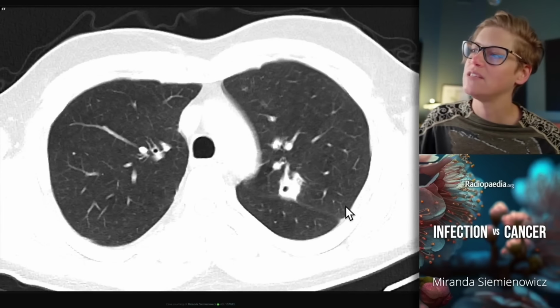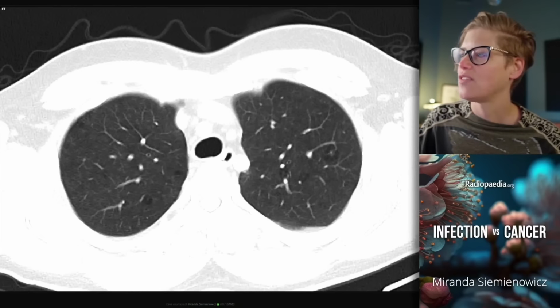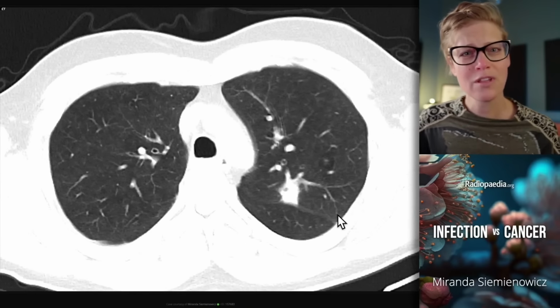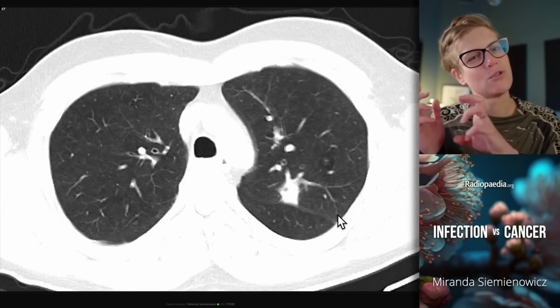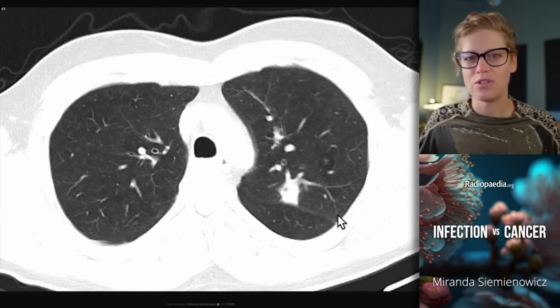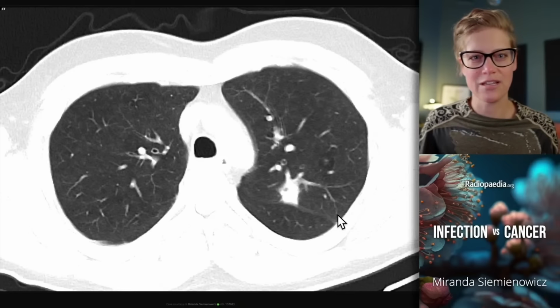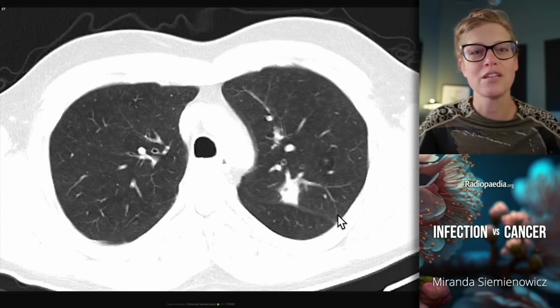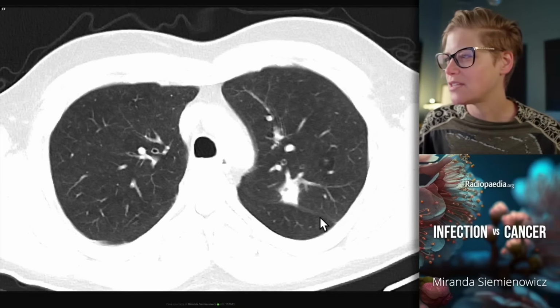Another small focal opacity in the left upper lobe, again, a patient with mild centrilobular emphysema, a risk factor for malignancy, but also a risk factor for pneumonia. Remember that the mucociliary escalator is paralyzed by exposure to cigarette smoke, so when you're doing that multiple times through the day, you've got a prolonged proportion of time that the mucociliary escalator is non-functional. You've got accumulation of secretions in the airways and the lung parenchyma, and a perfect medium for the cultivation of infection. This was reported as cancer, but when you and I scroll through this, what can we see?